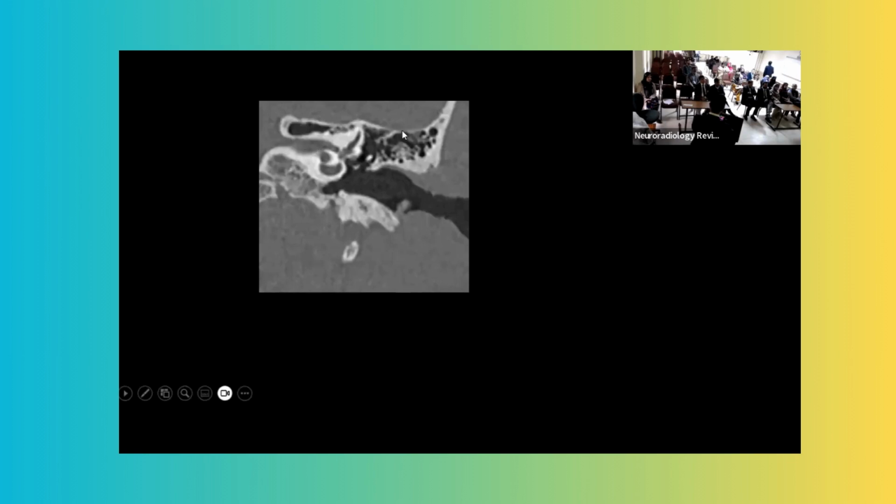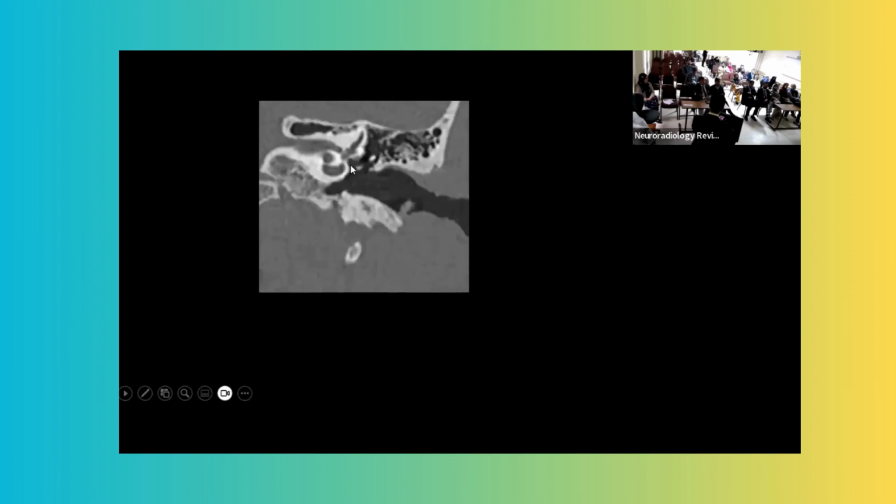And this bony covering of the mastoid is called tegmen tympani and tegmen mastoideum. And the middle ear is also divided into the epitympanum, mesotympanum, and hypotympanum. The one above the scutum is epitympanic recess or epitympanum, and then this is a hypotympanum below the level of external auditory canal. Some more images you can see. I think we can see the stapes here going into the oval window here. This is a very small bone which we can barely see sometimes.